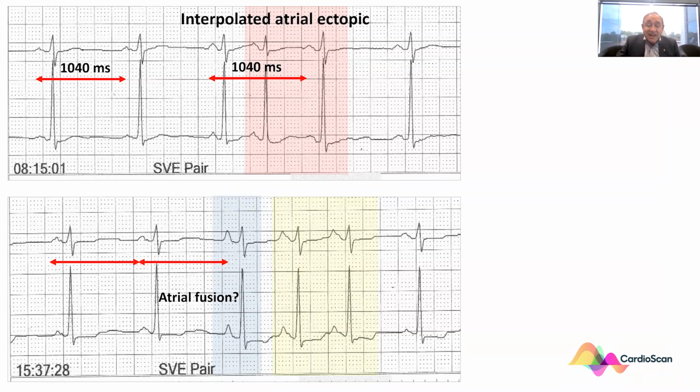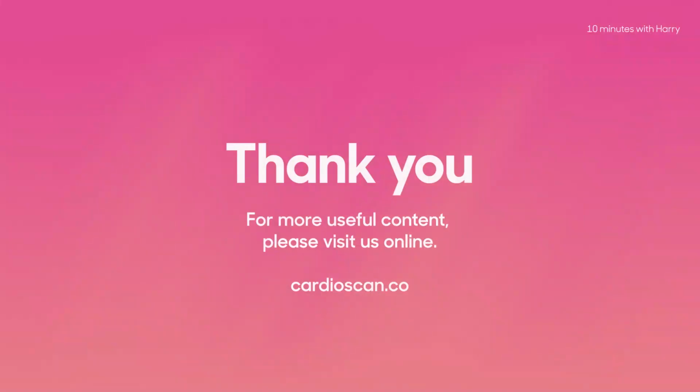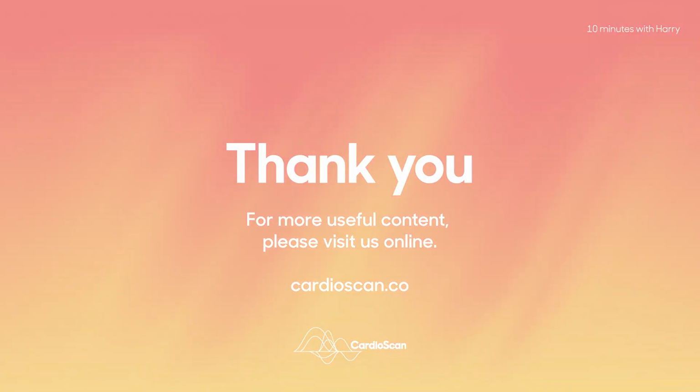And the timing again suggests that it is the ectopic that starts to depolarize the atrium first, then followed by the sinus node, and it causes fusion. Therefore, neither of these tracings, in fact, show an atrial couplet, but two different types or forms of supraventricular ectopy.